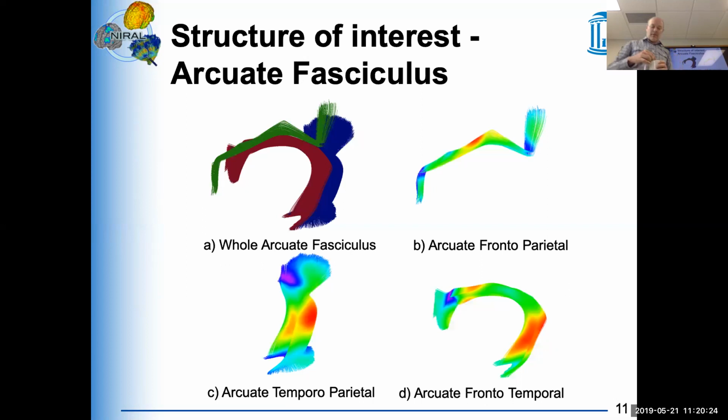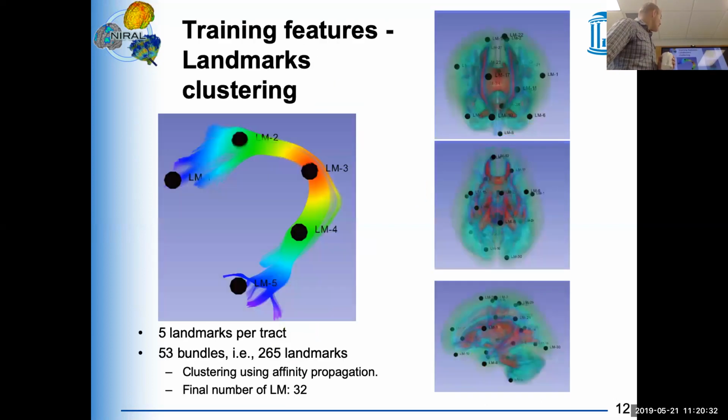We've had this defined on a lot of data sets for training, because that's one of the more complex tracts, the harder tracts to track. And the tool, during the training phase, takes all the tracts that we want to train with and determines landmarks along the tracts, and then defines distances to these landmarks.